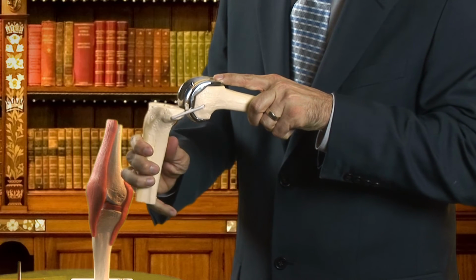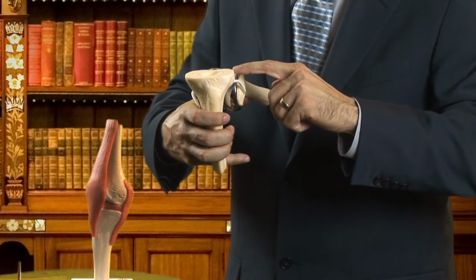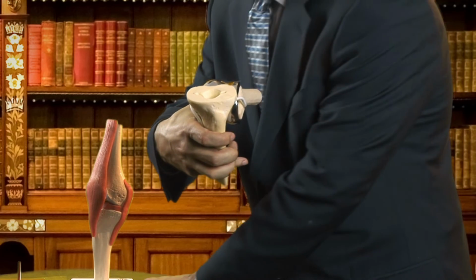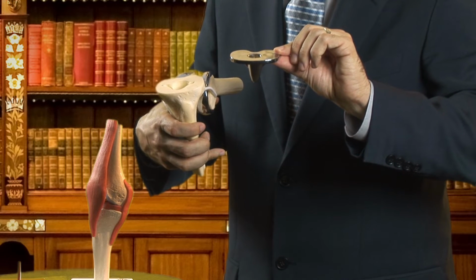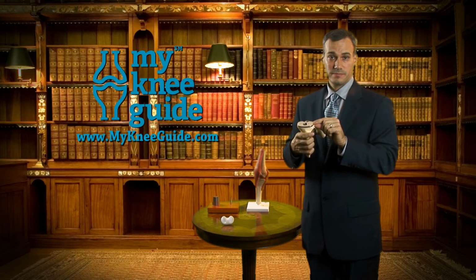Let's bring the top of the shin bone into position. You can see that we have a very nice flat cut on the top. Additionally, there's a central hole that has been punched into the top of the shin bone. That is for acceptance of the metal tibial component. The tibial component will be applied on top of the bone and typically cemented into place as well.